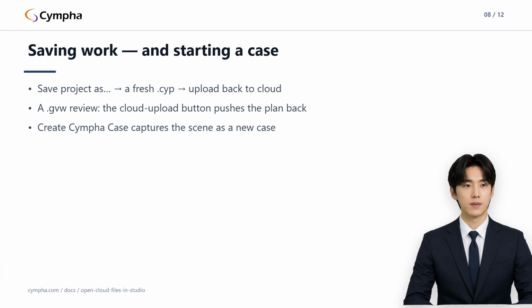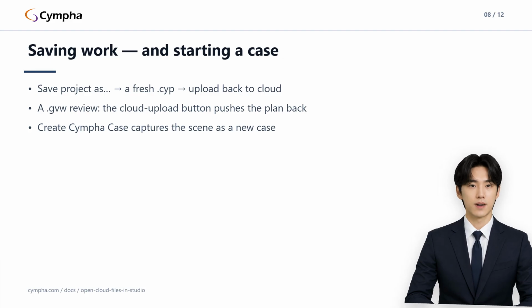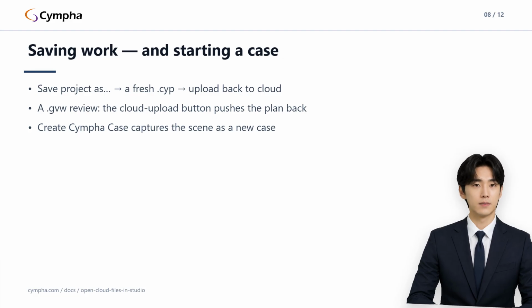One honest limitation: the Pro menu opens one file at a time, and there's no multi-select open in Studio in this iteration. 2 workarounds. The canonical one: if the files are parts of one design, upper scan, lower scan, bite, they belong in a single project bundle anyway. Build that in Studio once, upload the bundle back to my cloud, and from then on a single View in 3D Viewer click loads everything together.